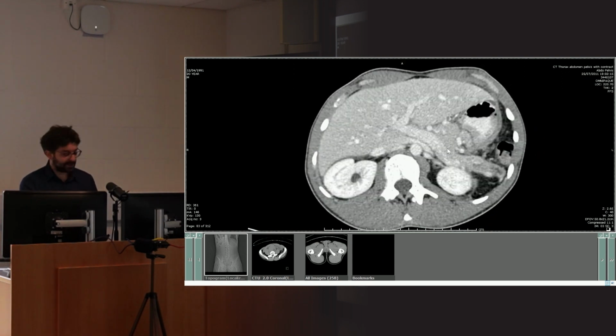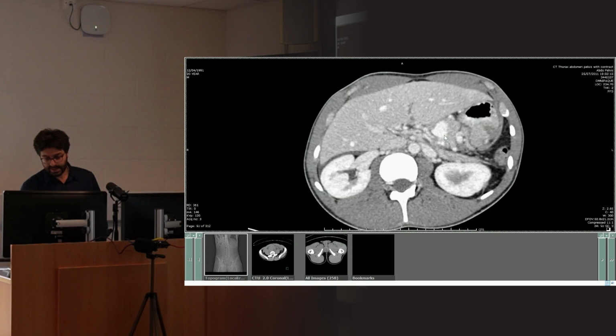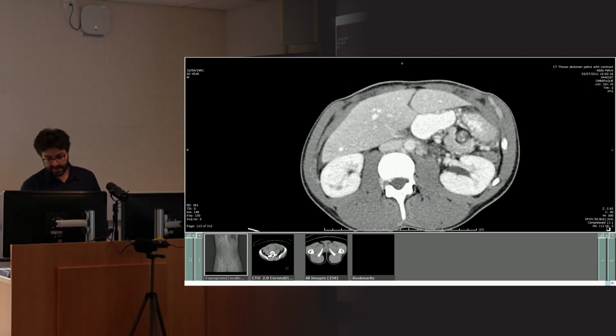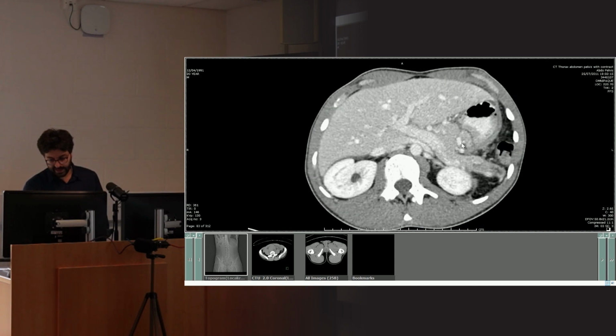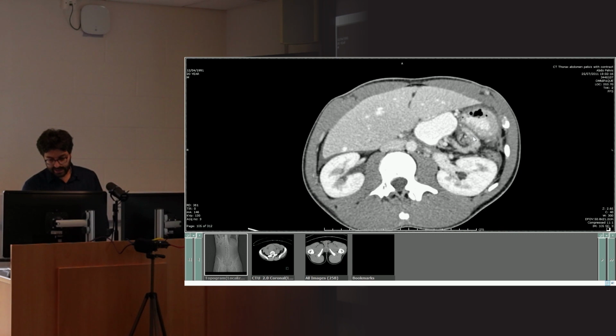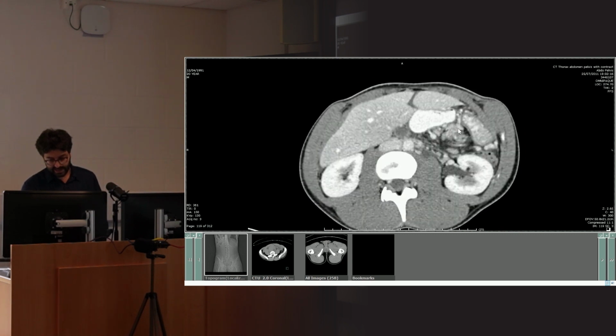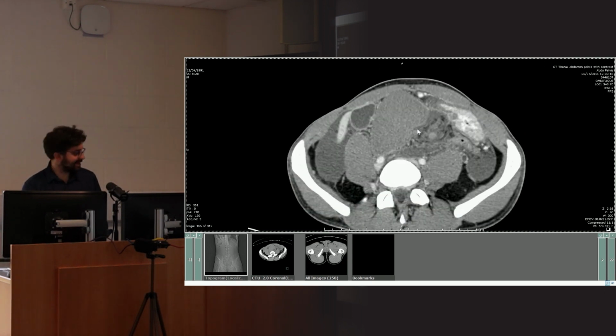Splenic vein is obviously going to be coming downwards, right? Because we know the spleen is in the pelvis, and the splenic vein therefore has to go down to the pelvis. But the pancreas is stuck to the splenic vein, right? So this here is splenic vein coming down, and there's a bit of pancreas here. And so what do you think this swirly thing is here that's spiraling down towards the spleen?